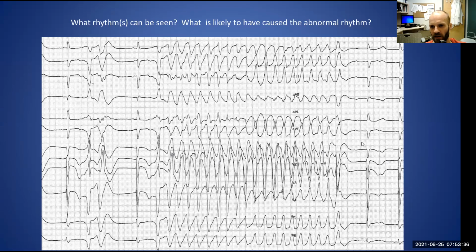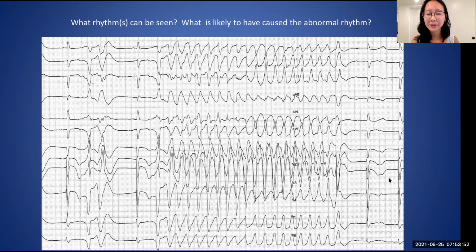But as a rough by eye thing, this is grossly abnormal. But this isn't the sort of trace that you'd use to accurately measure it. Does that make sense? Yeah, totally. Thanks a bunch.